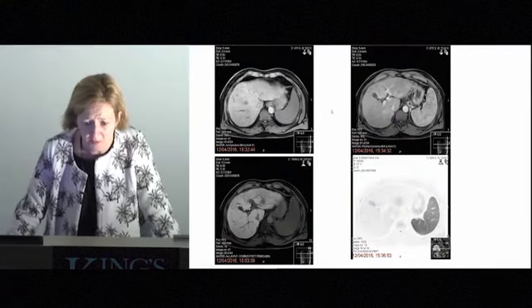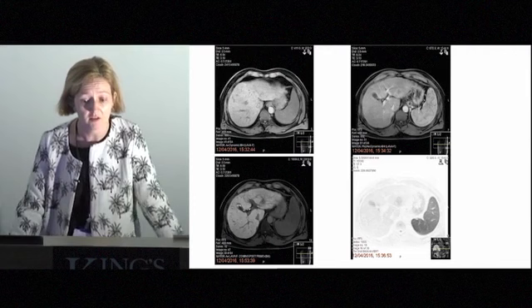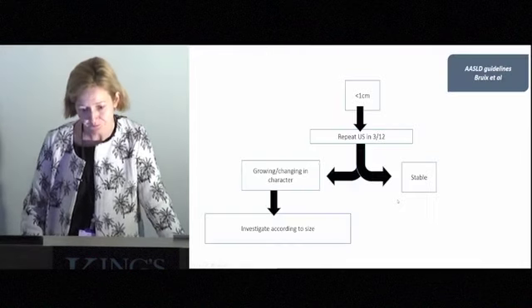Again, just a scan from this week. So here's the lesion on the arterial phase. Again, not a brilliant arterial phase MR compared to what you'd get on a contrast ultrasound. Here's the washout in the portal venous phase. Here's the hepatocyte-specific phase. And here's restricted diffusion.